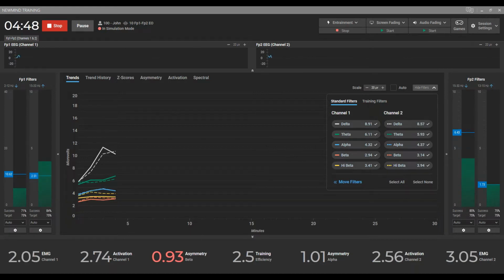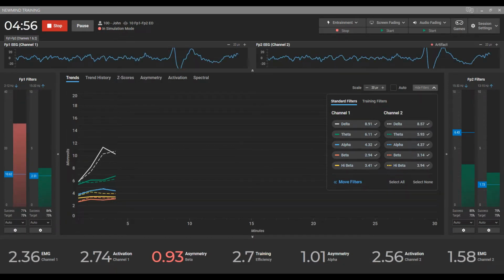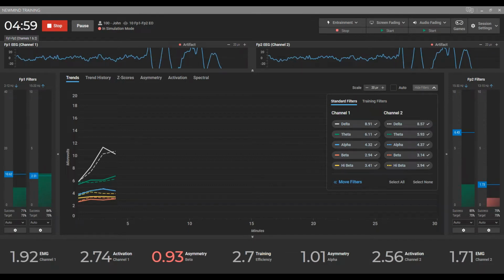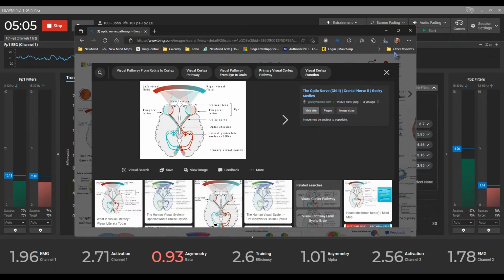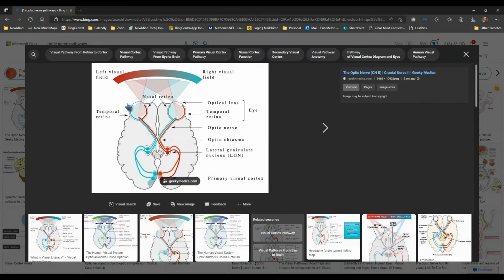Somewhere I think I have a document. I can actually just look it up here, because that is sometimes a concept you need to see. Yeah, so FP1 filter, I know I may have missed you saying this earlier. FP1 filters, that's on the left of the screen, is talking about your, okay, yeah, right. Yeah, so that's what I thought it was, right.